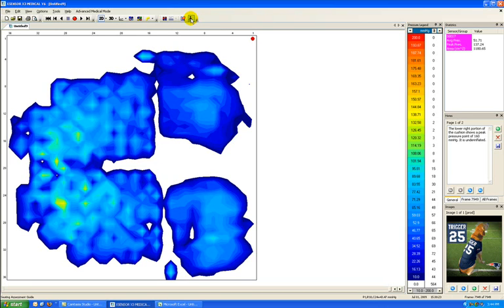The seating assessment guide is a valuable comparative tool that enables you to compare different seat cushions and add in required documentation, such as a Braden risk assessment, presenting conditions information, and equipment lists that can be compared and then reported upon. So we're able to compare cushion surfaces with all of the normal process that would go with doing a seating assessment.